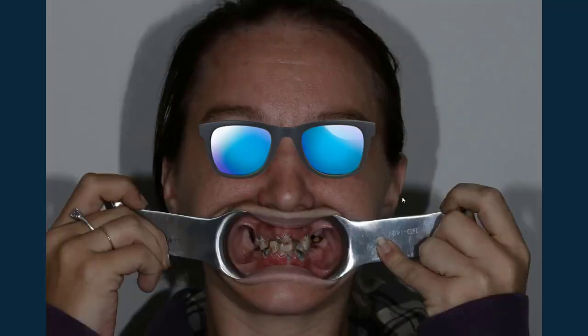And then we'll often take this, but I find this picture more useful for overall treatment planning, not so much smile design, because you can't tell much about the smile here. It can be useful for aligning 3D models behind it, like in exocad or Blue Sky Plan. But again, I'm usually using this more in treatment planning and patient presentation than I would for the actual smile design.